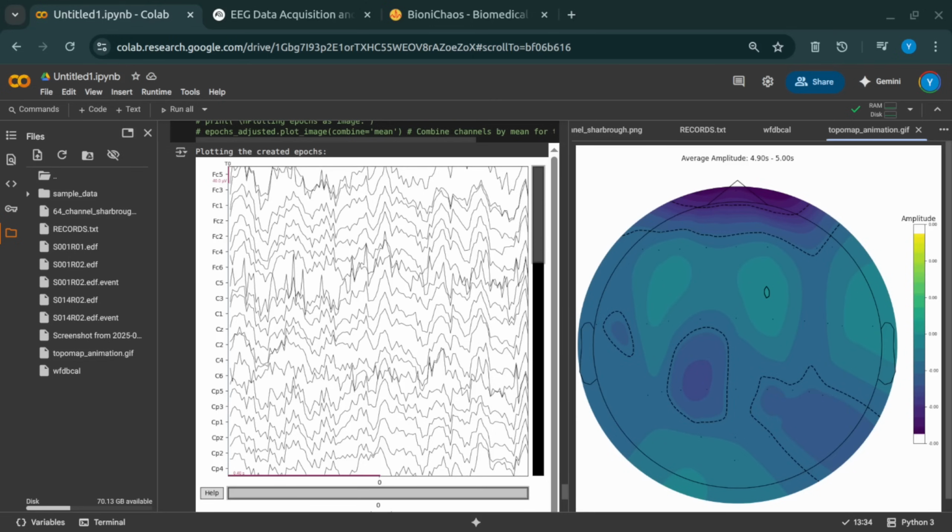This involved precisely defining our time windows and frequency ranges. We used the Welch method, which is pretty standard for this calculation. Getting this right is absolutely vital for isolating the specific brain activity we actually want to visualize without all the noise from other brain rhythms interfering. So you're filtering out the noise to see the signal you care about. Makes sense. And the third hurdle?